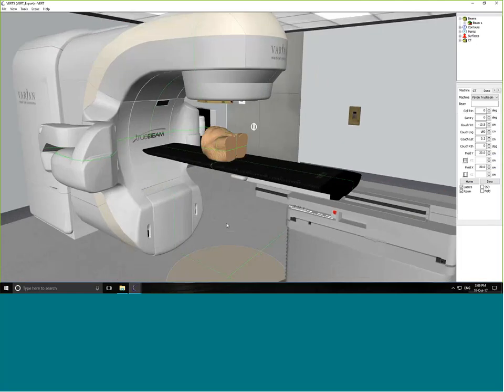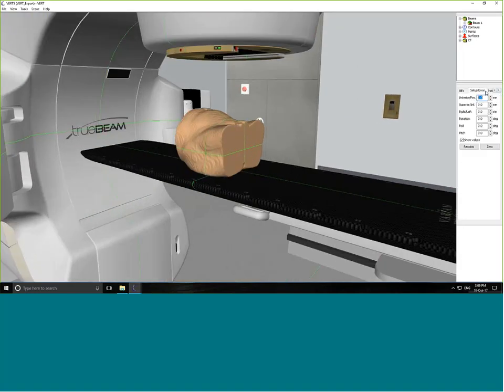So once we've brought through the plan we want to work with, we can then go to View and CBCT match interface. Now before I click that, I want to talk to you about how to input an error to this patient. There's a couple of ways that you can actually introduce an error. You can go the traditional route by going to Setup Error and manually inputting an error there. So I can introduce a vertical error or a longitudinal error, and then that error that I've created there will then be shown in the CBCT match module.